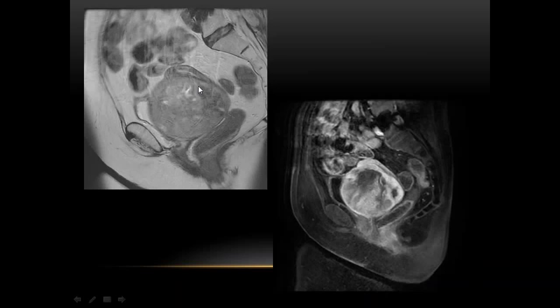And this is this woman's uterus. She was 70 and was having rapid increased size of her uterus with pressure symptoms. You can see it is pressing down on her bladder. When this was interpreted, we were very concerned that it could possibly be a leiomyosarcoma mass growing in a postmenopausal patient. At surgery, it was a STUMP.